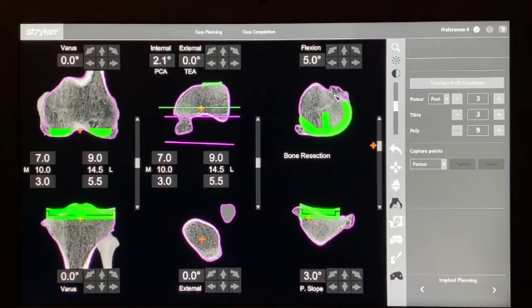So I think this femoral condyle now matches the shape of the native femoral condyle, whereas this is osteophyte, but the native bone follows a curve around here. If we're not sure whether this is the right size, you can easily move up one size or two, or move down a size to see whether you think this fits better. And often it's a matter of playing around with this until you think you've got it right.